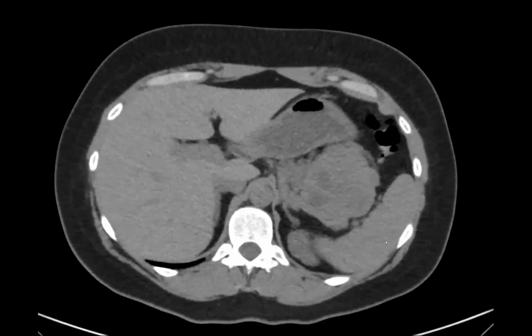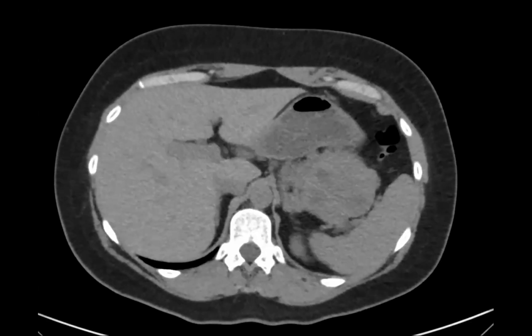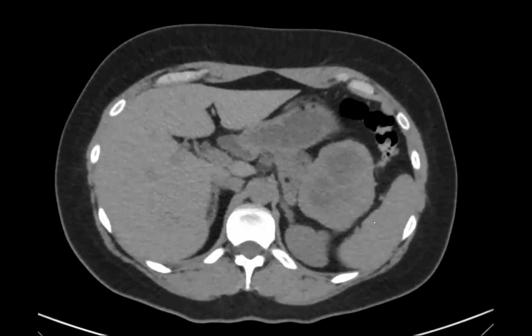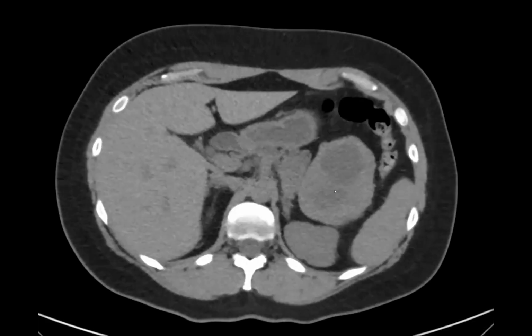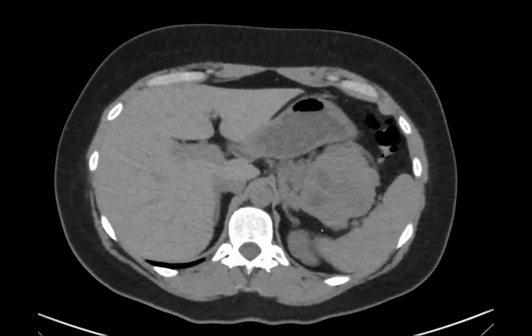Speak up, please. SPT, solid pseudopapillary tumor. Good. We call them SPEN, solid pseudopapillary neoplasm, but some people call them SPTs, so that's fine. Okay, good thoughts. So a solid and cystic mass coming from the pancreatic tail in a youngish female.